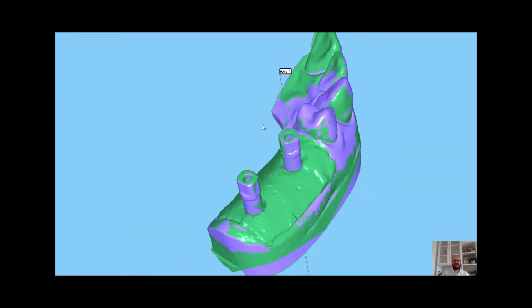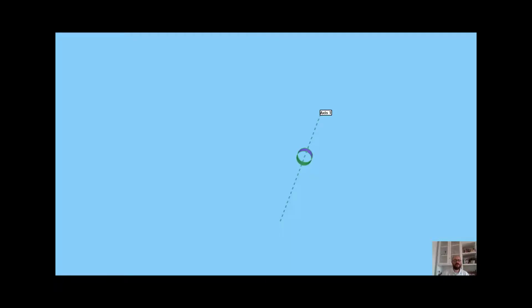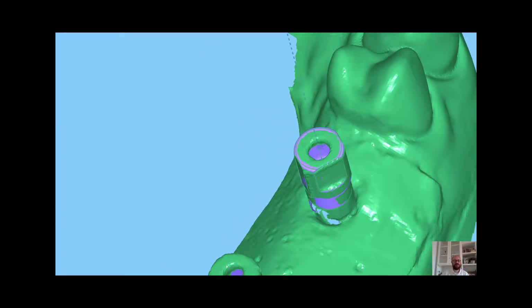Now I have the intraoral acquisition and the digital surface of the scan body. This one. There we are, perfectly registered, so in the right position. But the master, the reference, is the intraoral acquisition now, not the desktop as before.